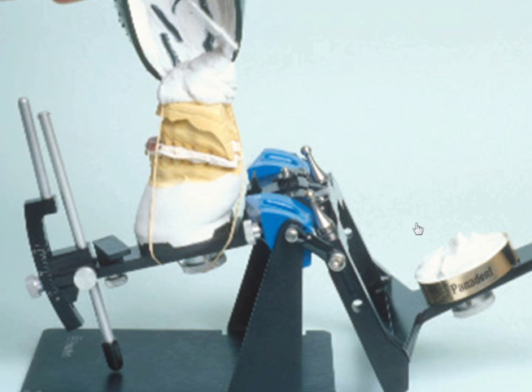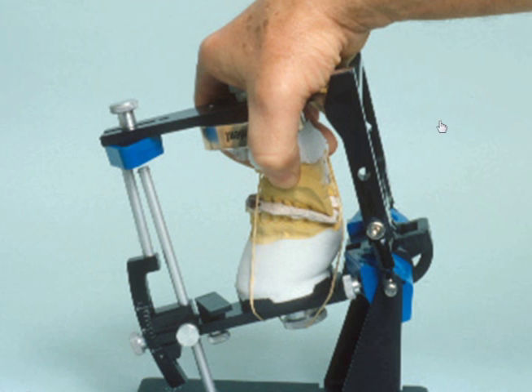Go ahead and mix the plaster and add plaster to the mounting plate as well as to the lower cast. We swing the lower frame around until the incisal pin touches the table, making a connection of the lower cast to the lower frame or mounting plate of the articulator.